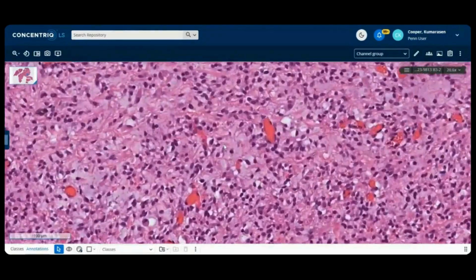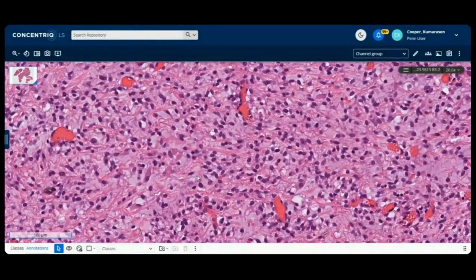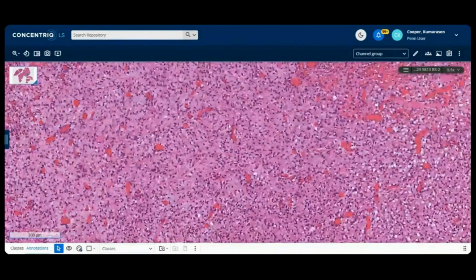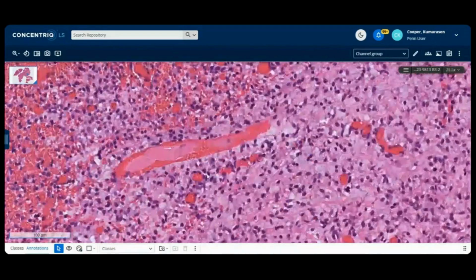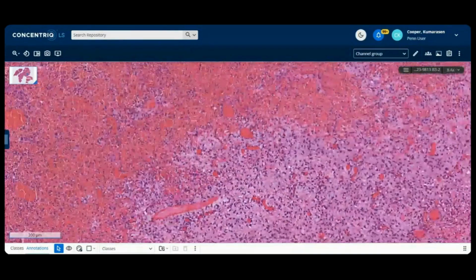So this tumor, I will add, is S100 and CD34 positive. So both those. I've showed you the collagen in the stroma. I'm trying to find some sort of collagen around vessels. I cannot find any collagen around vessels, but this is a difficult case.